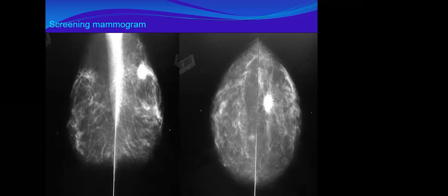So yes, even if not necessarily, it is BIRADS. From here it's BIRADS 4C. Why? Because the mass is spiculated. Spiculated, so it will be BIRADS 5. Sorry, did you forget? BIRADS 5, yes. This is BIRADS 5. But what is the significance?